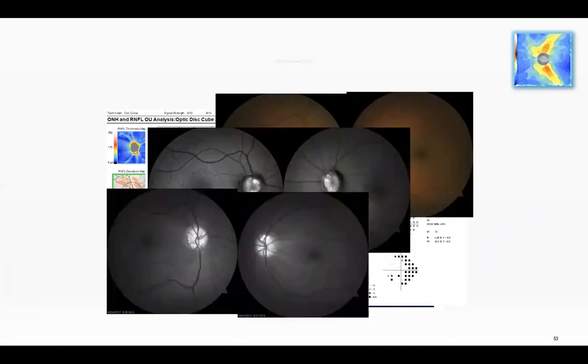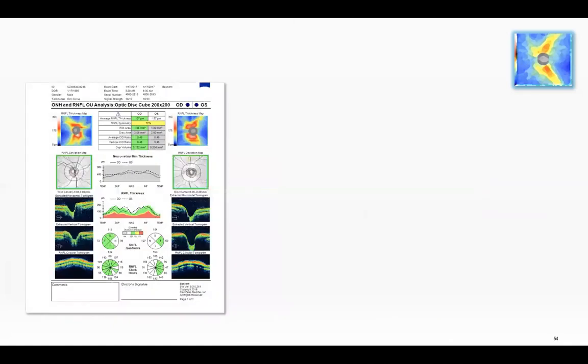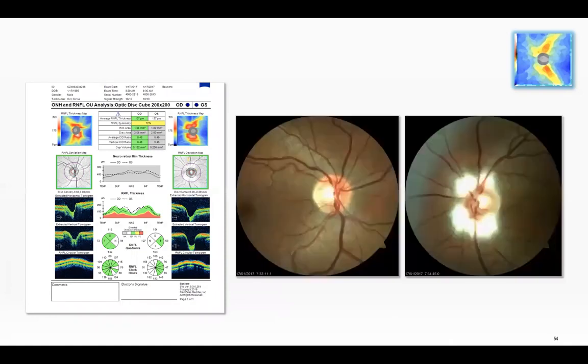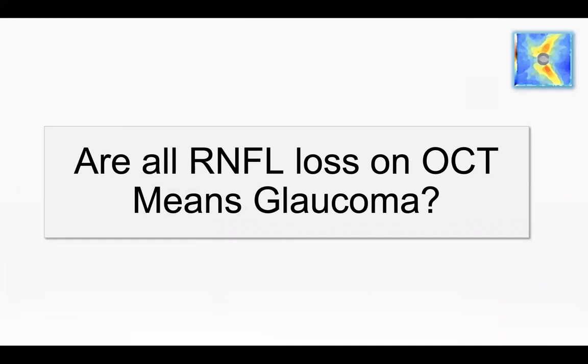You see, these are optic nerve head drusen and they can cause visual field defects looking worse in time. Other peripapillary abnormalities like myelinated nerve fibers of the RNFL cause segmentation and follow-up problems also. You see there is a very thick RNFL in this eye and it's very difficult to see if this cupping is glaucomatous or not.